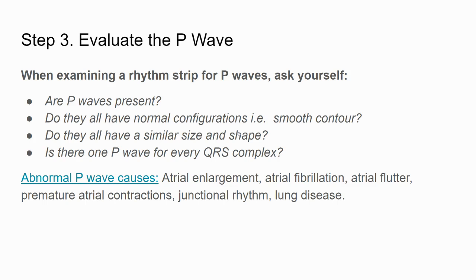You can have some premature atrial contractions, so you'll see they'll have this random P wave followed by a QRS complex, but your rhythm was mostly regular, and then you have this one random beat that came out of nowhere. And your P wave looks different. Well, that could just be a premature atrial contraction. It just came from maybe some sort of stimulus that caused a premature beat.